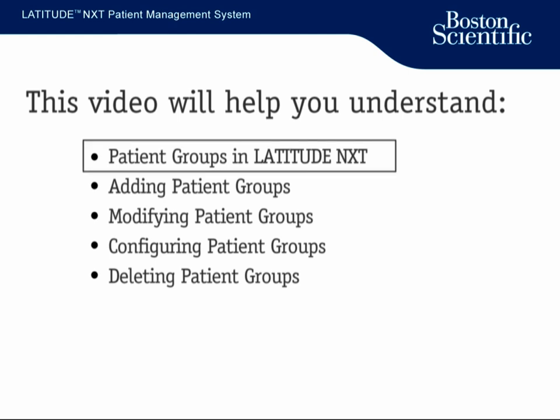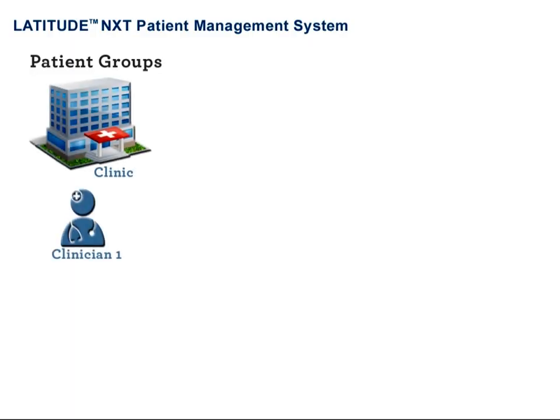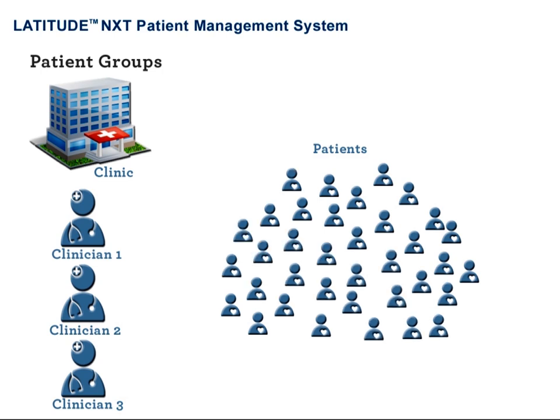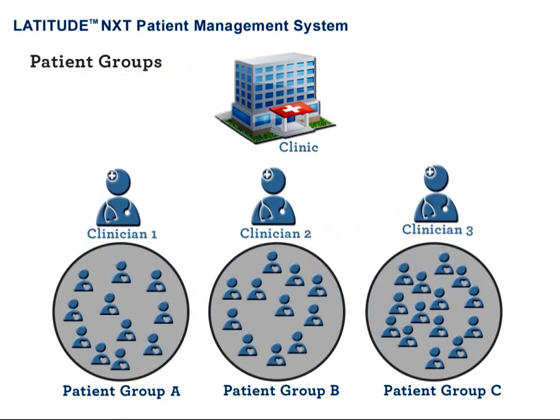We'll start by covering the basics of patient groups in Latitude NXT. Once your clinic is set up in Latitude NXT, you can further organize your clinic and your patients by making use of our Patient Groups feature. The Patient Group feature lets you decide how to organize patients according to criteria that make sense for your practice. Clinics can be organized into one or more patient groups within the system.